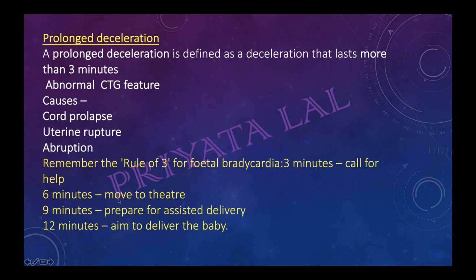The most appropriate, what should be the answer, ma'am? Okay, yeah. So if they have given this kind of CTG and they ask you the next step, the answer will be call for help, because it is an emergency. But if they ask you what is the most appropriate step, your answer will be expedition of delivery. Deliver the baby. Okay, now the thing is clear.